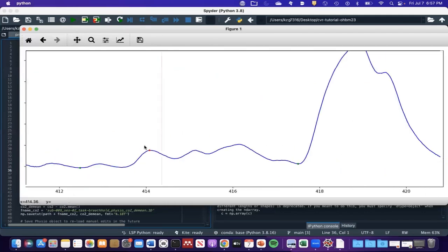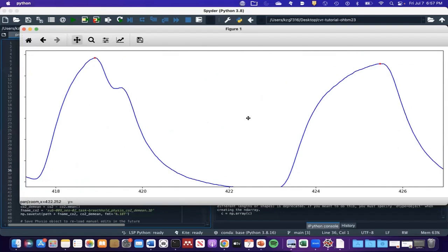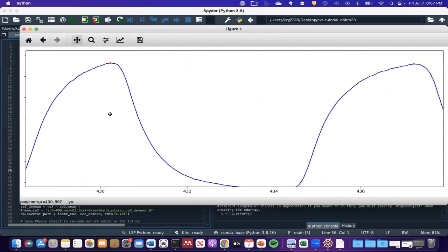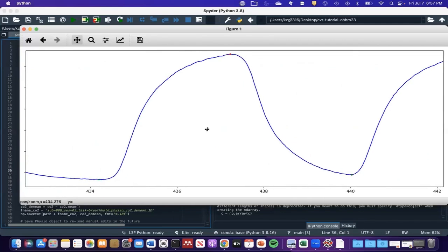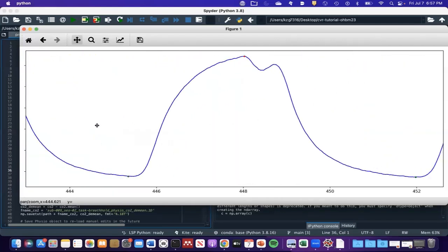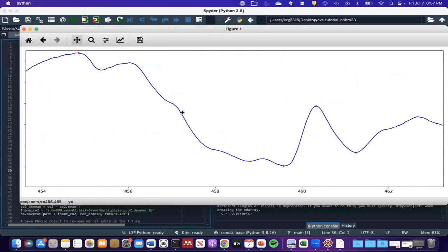And now we want to save the array of indices where those peaks happen in our CO2 trace as a separate file. So first we need to export, set them to a new variable. So we've saved those peaks in this object.